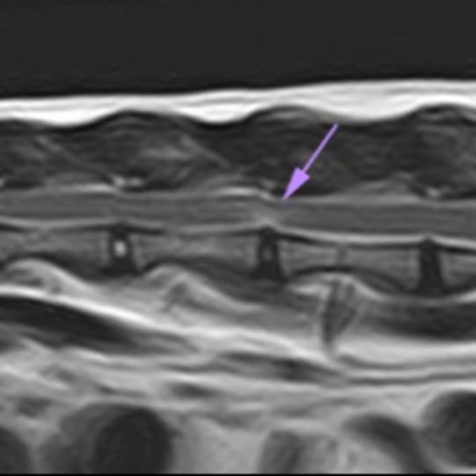Additionally, a different age predisposition to intervertebral disc herniation by breed was found in the study by De Decker, with purebred cats being affected younger. In our study, we didn't find a statistically significant difference between the two groups for age, and probably this finding is related to the very low number of purebred cats in our population of cats.